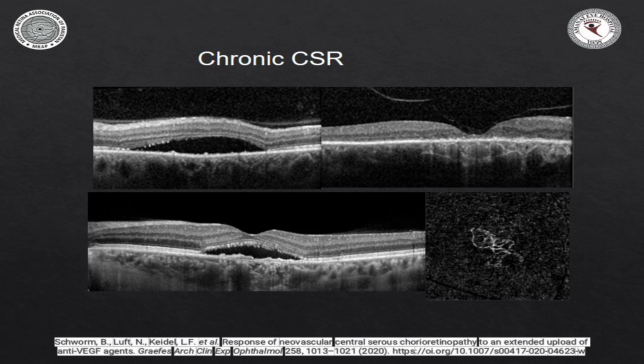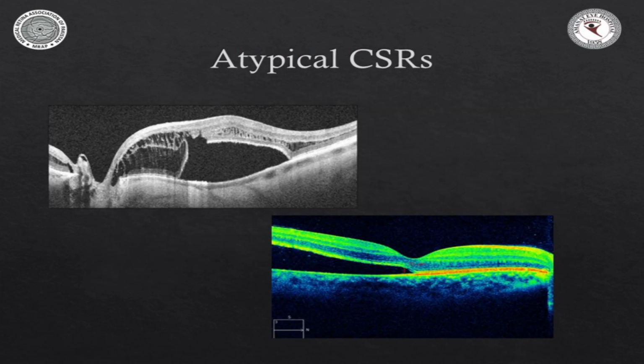Again, be very mindful of a CSR जिसकी peripheral extent आपको नजर नहीं आ रही. And it does happen when you're running a retinal imaging center that a typical rhegmatogenous retinal detachment will present to you like this. And we look at the central OCT and we say, अच्छा ठीक है CSR है, Eplerenone दे दो. But only when you look at the fundus examination, you find out he actually has a shallow RD.